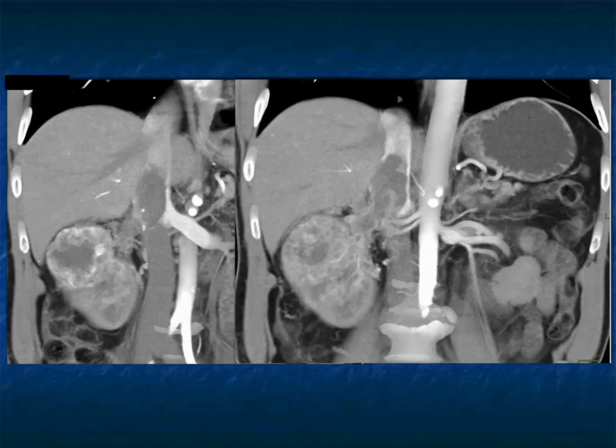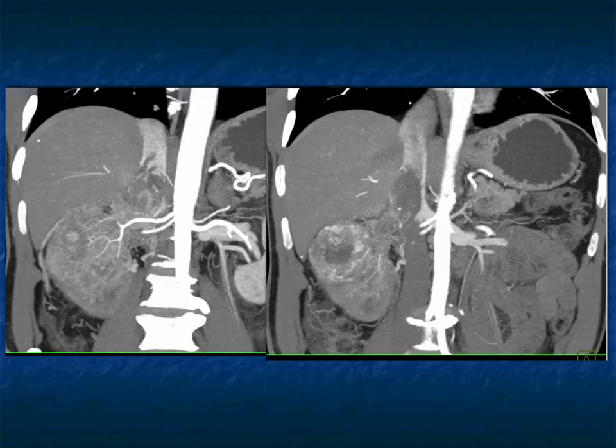When you get to venous phase imaging, you then see the thrombus in the renal vein. You see the tumor necrosis. You see it extending up the IVC, but not up to the level of the patient's left atrium, or right atrium. Very important to be able to see the extent of thrombus, not only the presence of thrombus and neovascularity.